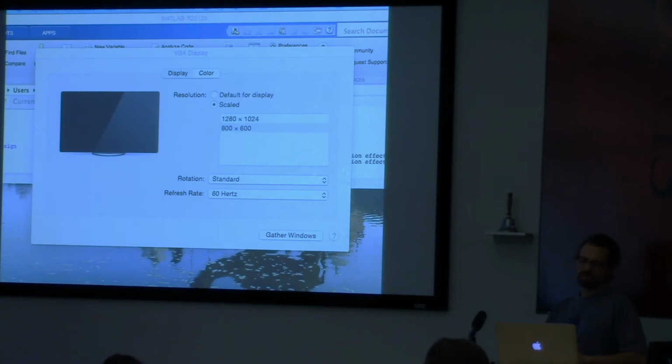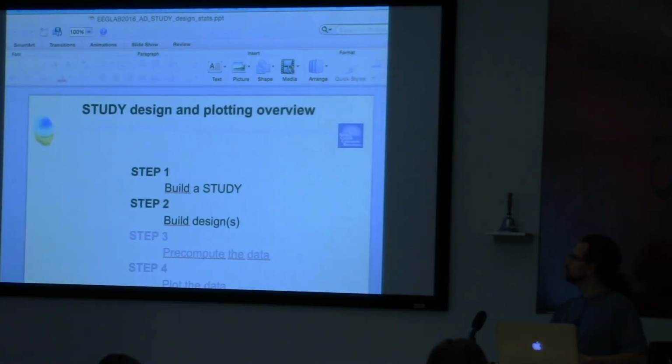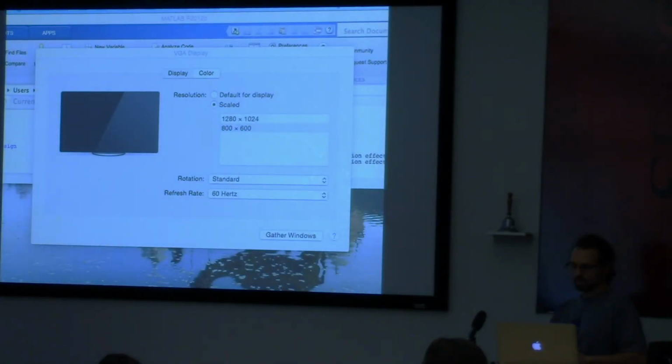So you can also plot statistics below the ERP. Instead of just in a separate plot, you can also set a threshold and plot it below the ERP. Maybe I'll just do it like this for now to make sure it doesn't crash again.